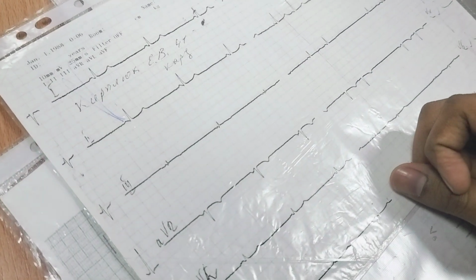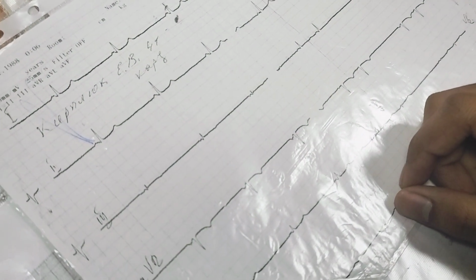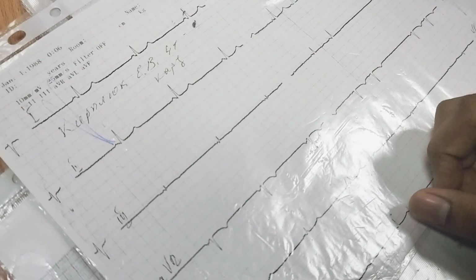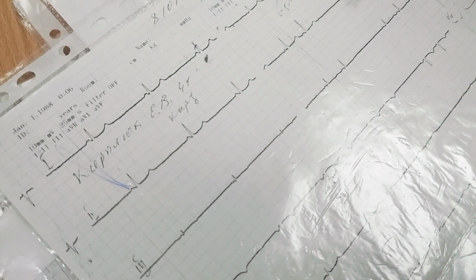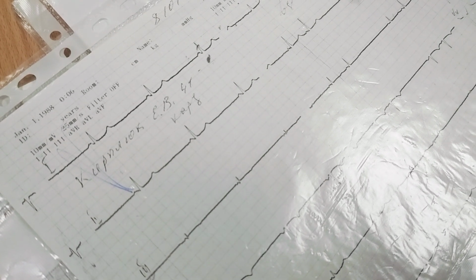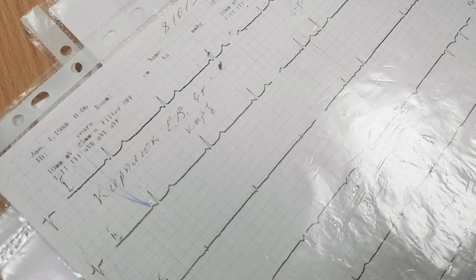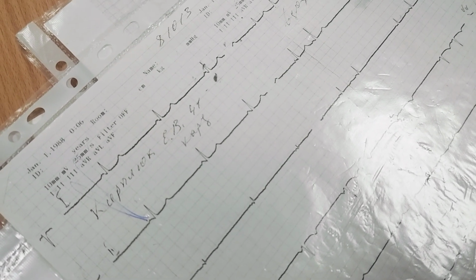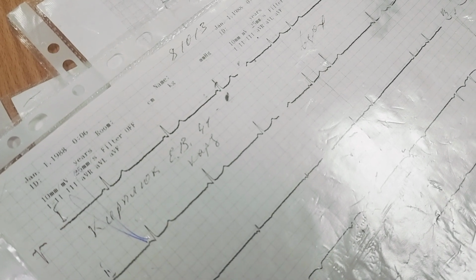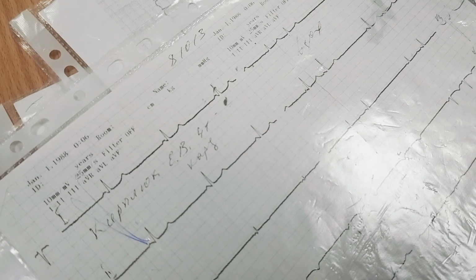Every time we register an ECG, we do the registration in normal breathing. Next, we ask the patient to keep inhale and register the ECG again to find respiratory effects. Some patients register ECG during exercise. It is another test, exercise testing. We do it to provoke arrhythmias or ischemia if we cannot find them on the simple card. Why do we specifically take an ECG in the inhale moment? To find respiratory arrhythmias. Sometimes inspiration can provoke arrhythmias, heart blocks, or something else. To find it, we need to ask the patient to keep inhale.